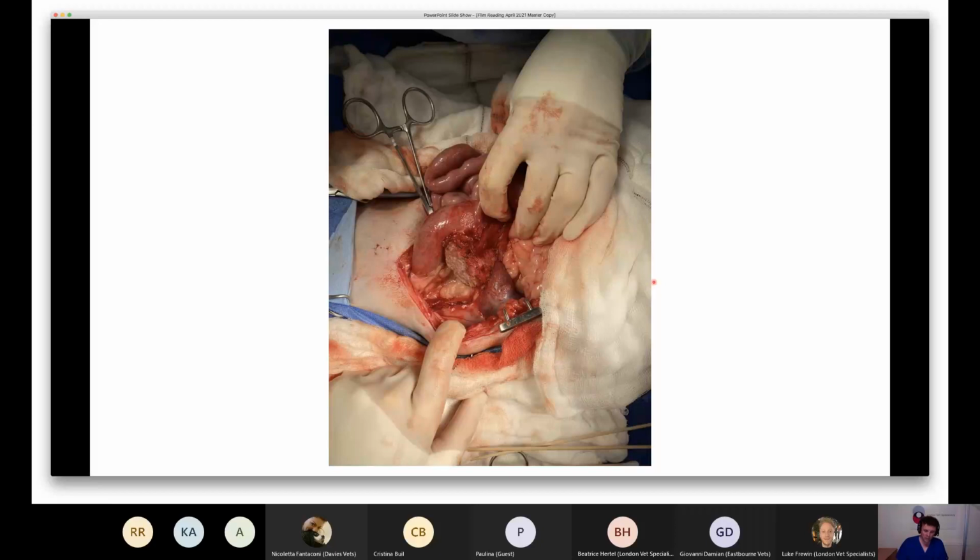The reason why this case has been included is I think it's super important that you guys know how to recognize this when it happens on radiographs and on ultrasound, so that you can correct it as quickly as possible. Mistakes happen, and this just illustrates how important it is to do a swab count, even for routine surgeries like ovarian hysterectomy. So yeah, this was a retained swab that was removed. Mr. Pomsky is doing absolutely fine.